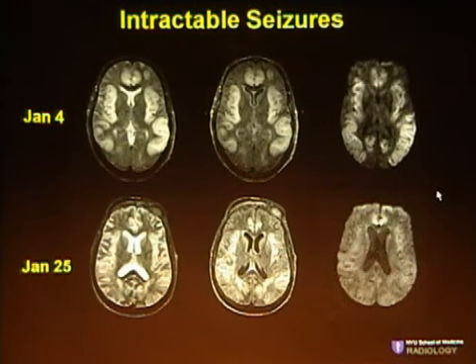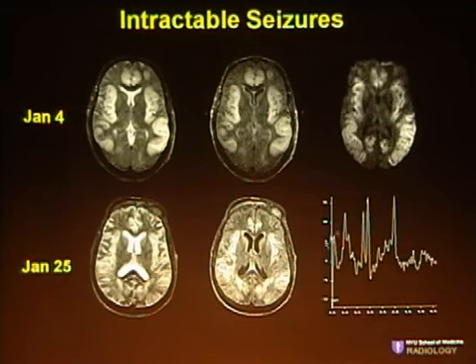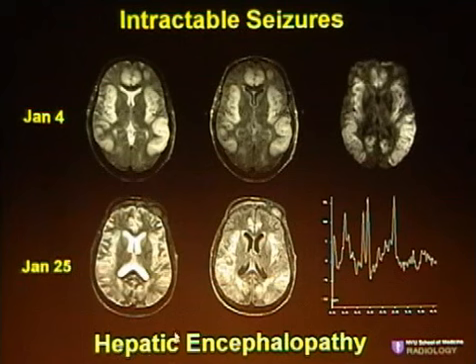This was a case that was very difficult for us as well, and we did MRS on it, and what we found on MRS was that there's decrease in NAA, there is some increase in glutamine-glutamate, there is some increase in the choline peak here, as well as a decrease in the myo-inositol. Okay, anyone have a diagnosis now? Okay, so if you were to see this spectrum next time, you will know that you will see this abnormality in the setting of hepatic encephalopathy.